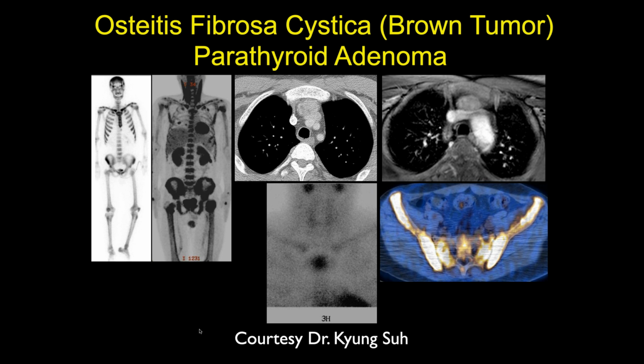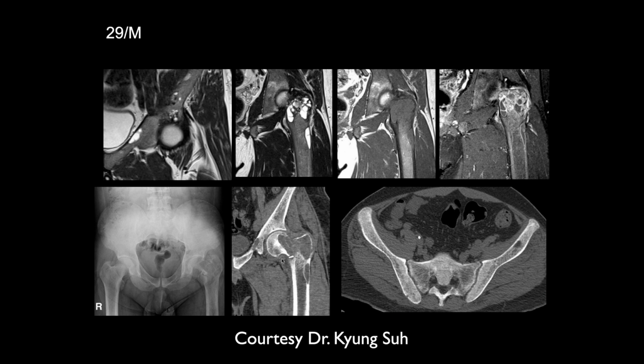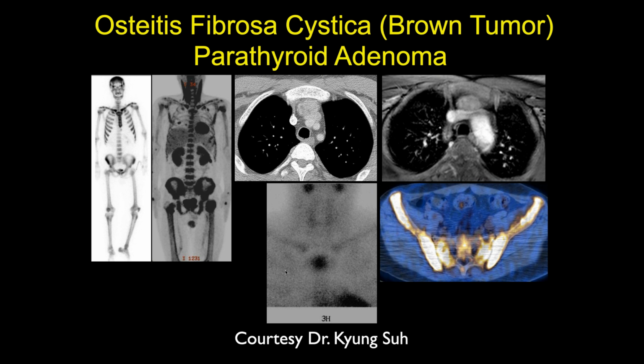So you fix it before it breaks, because sometimes it'll break before you can get to it. You don't want that, so you do pre-fracture surgery. Here's a fracture right here. We're a little too late on this one. Yeah, it's already broken.